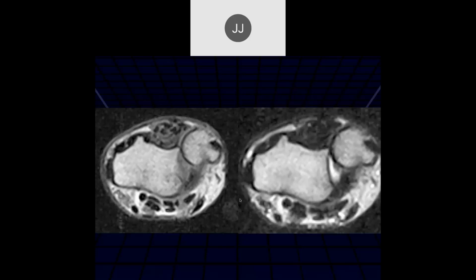Okay, so here we see the distal ulna dorsally subluxed. Suggestive. And that's what a lot of people call it. Remember, the ulna is the stable bone. So technically, what you're seeing is subluxation of the radius with respect to the distal ulna.